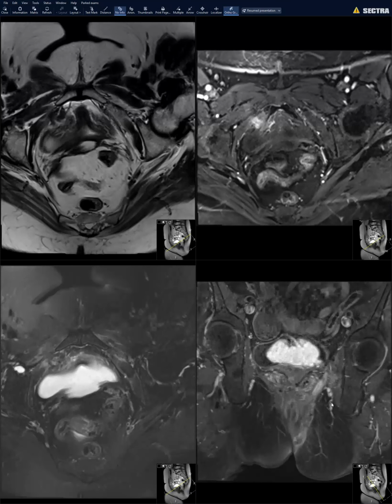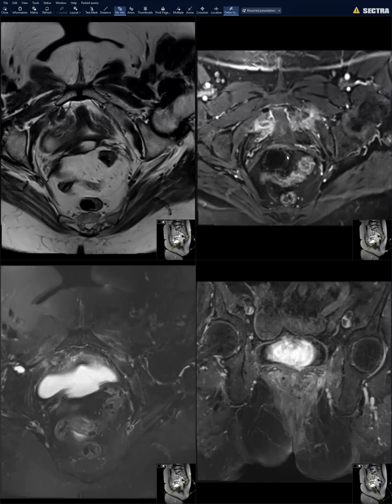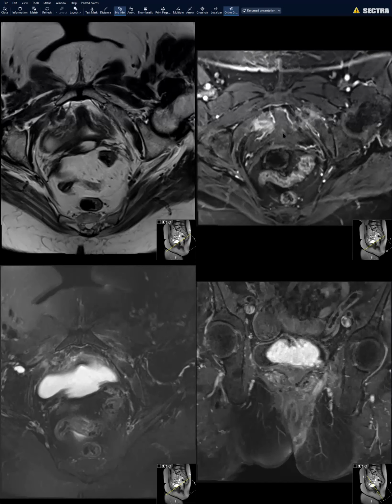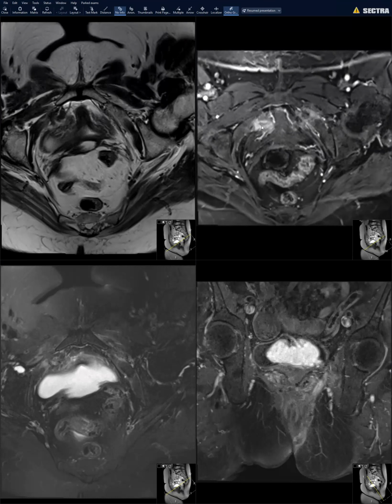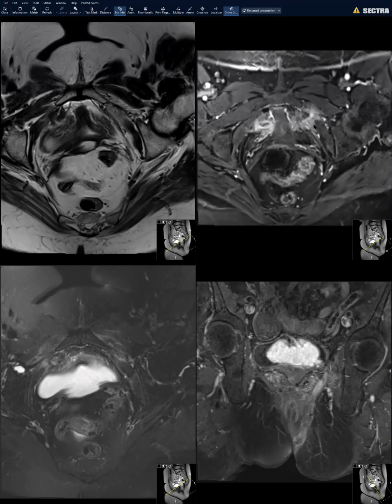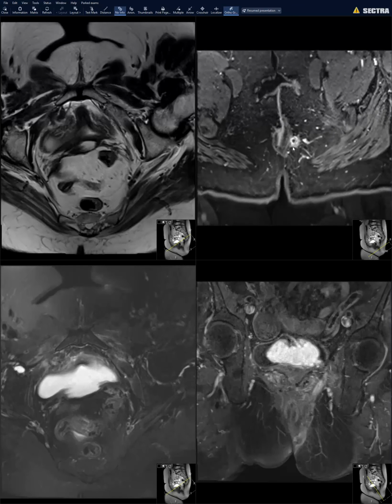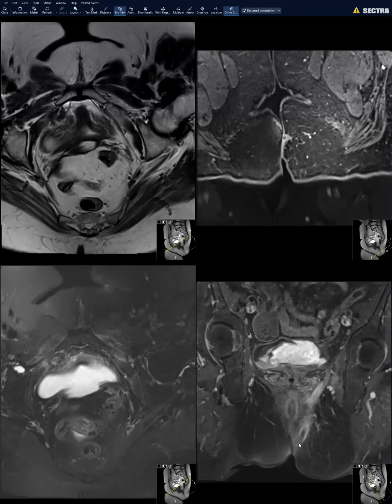So it's like a urethral suspension procedure, like a trans-obturator approach. And there's all this inflammatory change. Right. So this was actually an attempted trans-obturator, TOT, trans-obturator tape placement, which, like Nelly said, is one of the mid-urethral sling procedures. And you can see where their trocars have gone because these slings get anchored in the obturator membrane or fascia. And then arising from that left-sided tract, now we have a secondary dissecting tract, which has formed almost like a vaginocutaneous fistula. So this is a known complication.